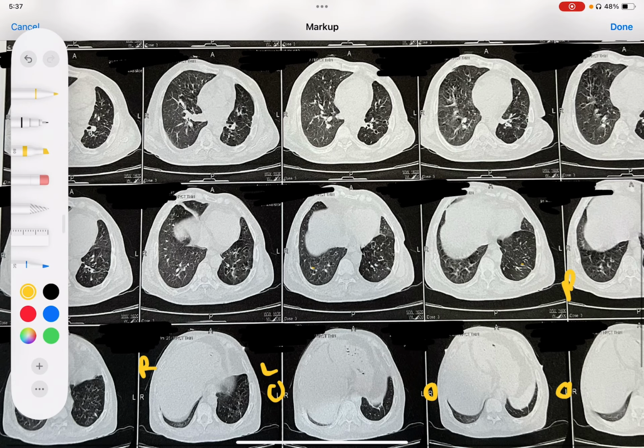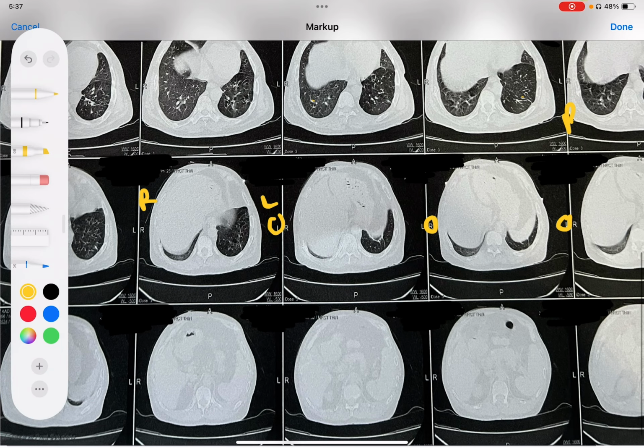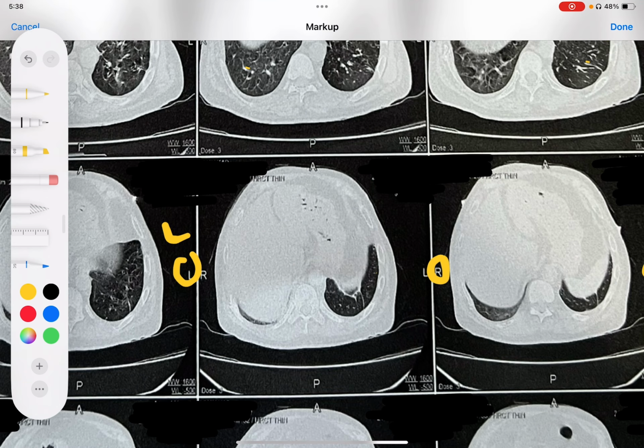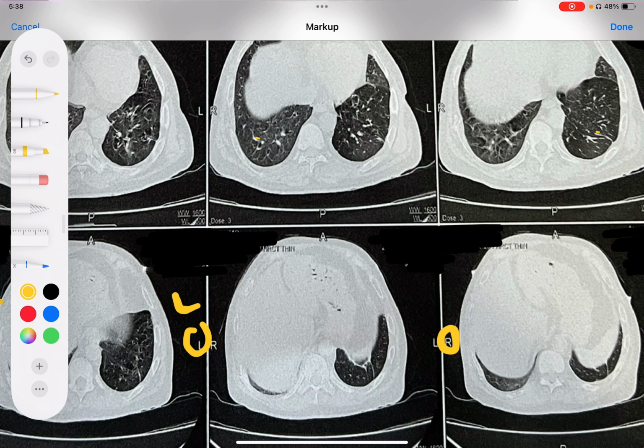It's very difficult to find a good normal lung parenchyma, but I'll still show you that this type of lung parenchyma we would consider to be kind of normal, because we can see there is no prominent dilatation of anything, there are no whitish bands, and there is no lesion in this space, no whitish bands, no whitish lesions. Just compare this type of lung, the blackish radiolucent. This is comparatively the normal lung compared to this.